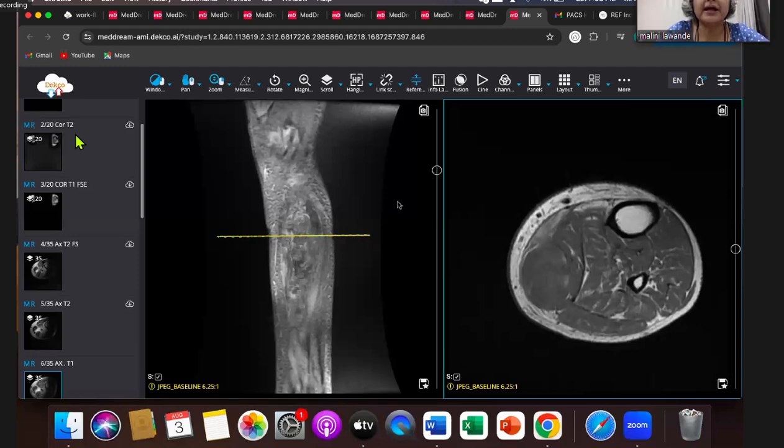How to definitely diagnose myositis ossificans and malignant soft tissue tumor with calcification? Calcification in a tumor will not be peripheral. Myositis ossificans starts peripheral and then goes central, while the tumor ones are usually central and more stippled and coarse. And the edema is disproportionate. In a neoplasm, you will never get so disproportionate an edema, and the peripheral ossification.